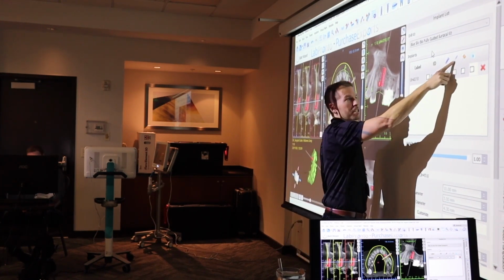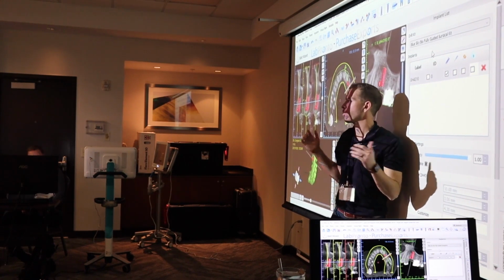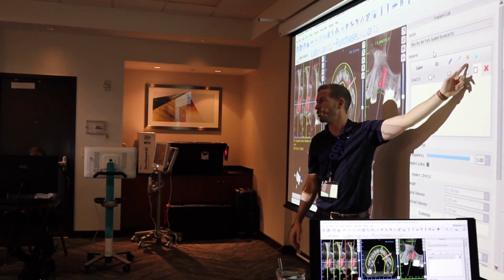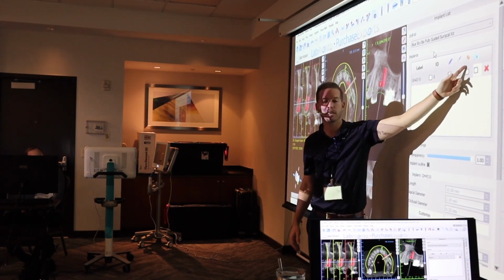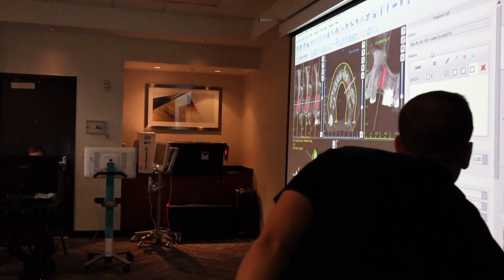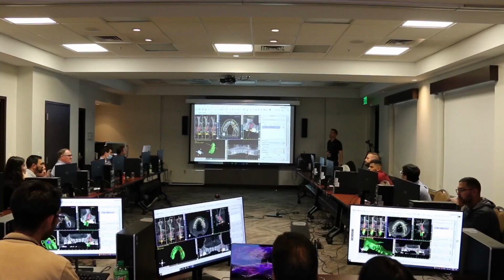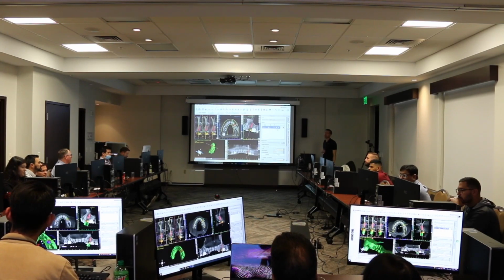The second section is the abutment. We haven't added an abutment. There's no digital abutment. We're not doing that yet today. The third section is the guide tube. So this is where we have to turn the guide tube on. So we need to check this box right here. So everybody should have it look like this. Now that yellow guide tube that we talked about is now showing because this is the important part.